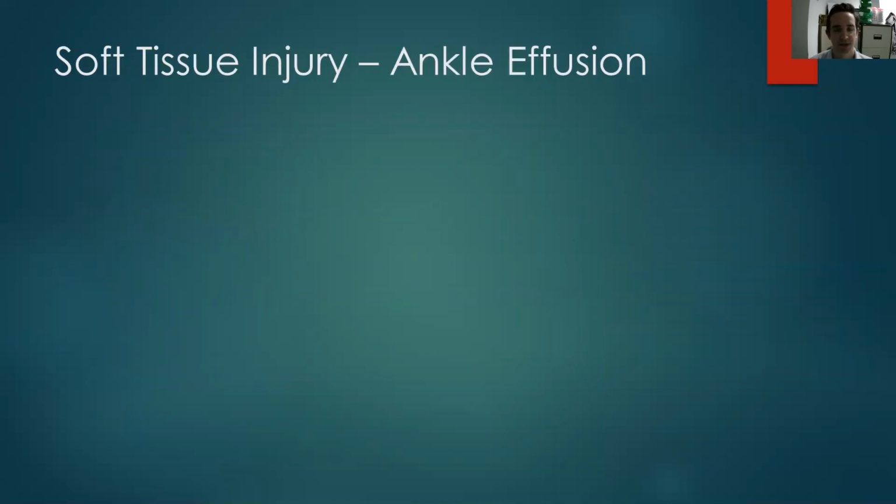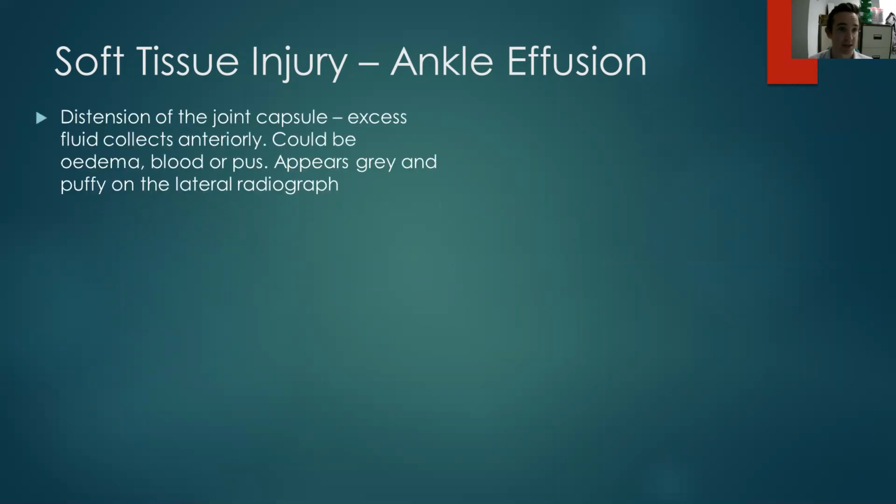So we're now just going to start discussing some soft tissue signs. Now, unlike an elbow, an ankle joint effusion is not an absolute red flag that there is an occult fracture until proven otherwise. It's not like a lipohaemarthrosis in a knee where there is an occult fracture until proven otherwise. But your ankle effusion is still helpful. Like all other joint effusions, it is a distension of the joint capsule that's been caused by hemorrhage in the context of trauma.